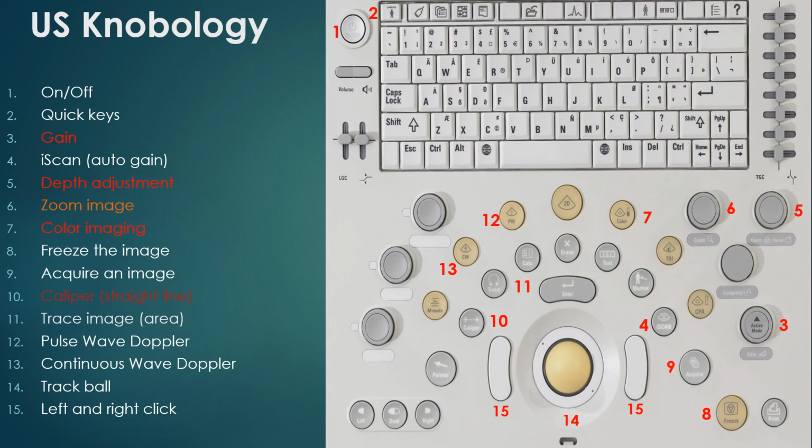So along with finding the view, which is pretty darn difficult to do until you get the hang of it, knobology is something that's just extremely intimidating. And at least in cardiac ORs, it almost scares you to the point of not wanting to even look upon the evil transesophageal echo probe. But there's a few knobs that you absolutely have to get the hang of.